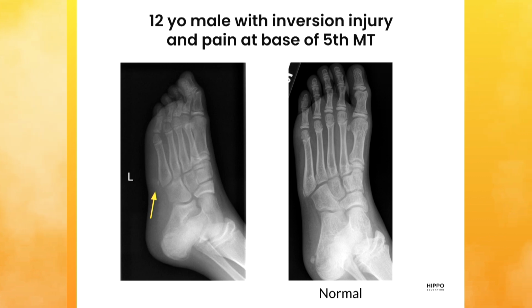So when we take a look at it, we can look up a normal patient that's that age, and what do you see on this normal study? I mean, it looks like the same thing, but sort of stuck closer to the bone to me. Yeah, I agree. So we're seeing something that looks similar. It doesn't look exactly the same, but it looks similar.